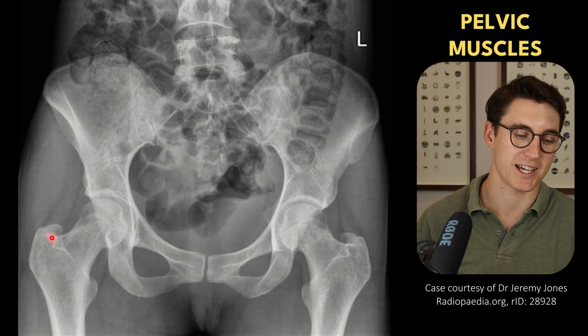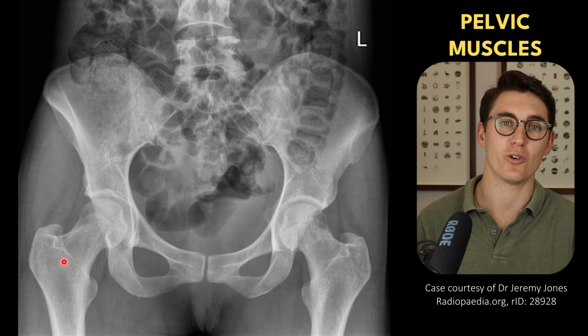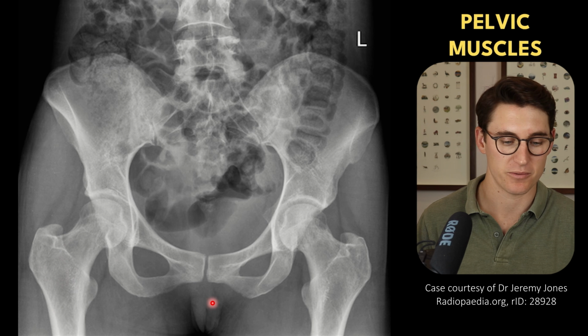And there are many muscles that attach to the anterior aspect of the greater trochanter, which are more involved with the femur itself, involved in extension of the knee. And we're going to talk more about those muscles when we look specifically at the hip and the femur itself.